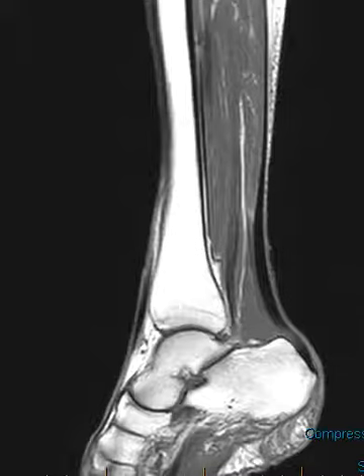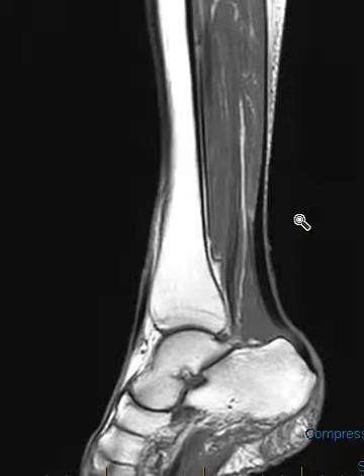Hello, this is Dr. Gay from First Look MRI, and this is an elderly woman who had pain in the leg. They thought maybe it was a tibial stress fracture or possibly Achilles tendon injury. We did an MRI from the knee all the way down to the ankle, and here I zoomed up on the distal part where we see a finding.